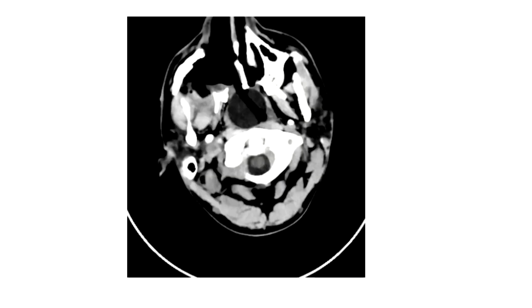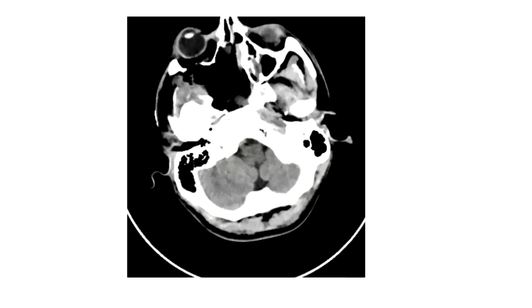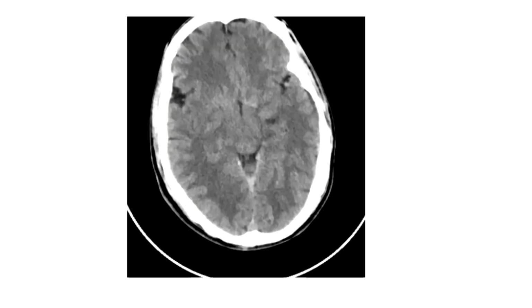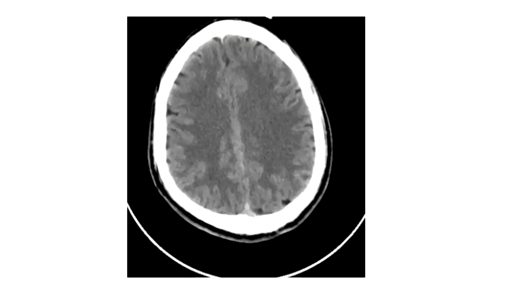This is the CT scan post-operative. Tumor has been completely excised. There was no complication, no infarcts, no bleed. This is a contrast scan, and the patient did well.